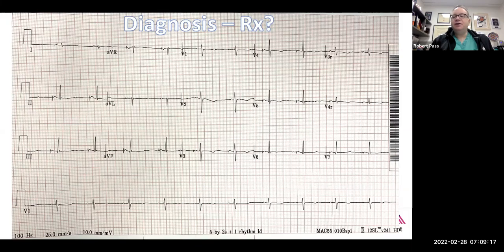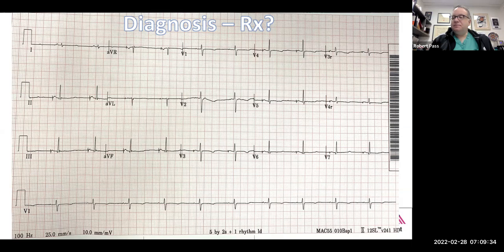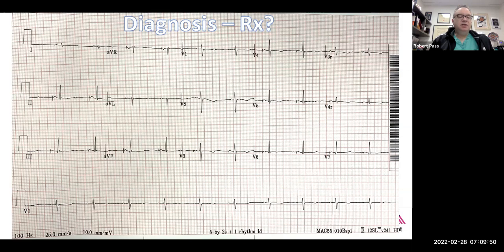Yes, that is a rule of thumb, not a guarantee, but yes, it's a rule of thumb. It's almost looking like half to me, so that's why I didn't say long QT from the very beginning. I was saying that's what I was thinking, that it does look long. And that's why I counted, and I'm getting almost 11 small boxes. I think it might even be a little longer than that. It might even be 12, or somewhere in between there.